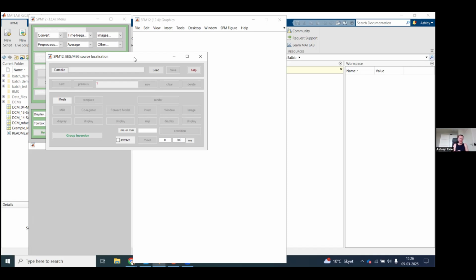So it estimates the sensor data in a vector of source space, and also a lead field, which is the mapping from sensor space to source space. But the lead field, or the gain matrix, as it's also called, is saved as a separate file. Now, when SPM saves this gain matrix from the source reconstruction, it hard codes a file path in it. So even if you've downloaded the entire GitHub repository, which the gain matrix contains, it has a hard-coded path, and it looks to one of my laptops that I had like 50 million years ago.